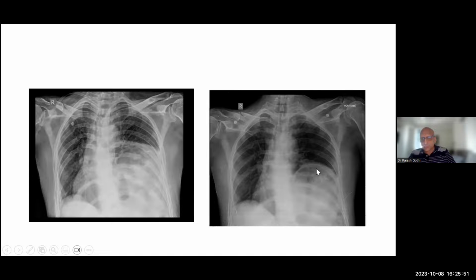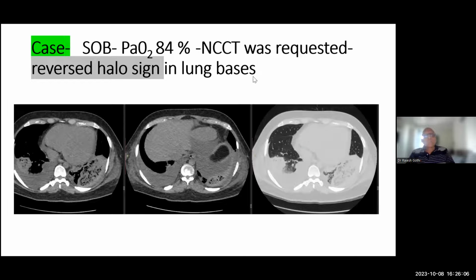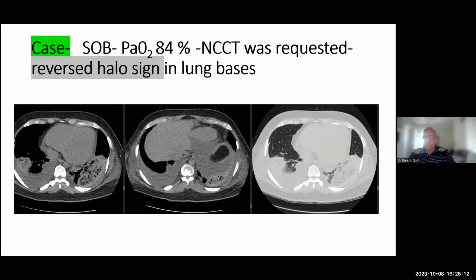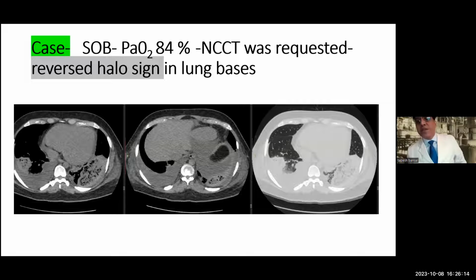This lucency over here is due to the fat. Mediastinum is shifted to the opposite side. And that is what we found in this patient. This patient was 47 years old and he had antiphospholipid antibody syndrome. Another patient now came with... Sorry, sir, what syndrome? Antiphospholipid antibody syndrome. The eventration was, of course, incidental. Okay.